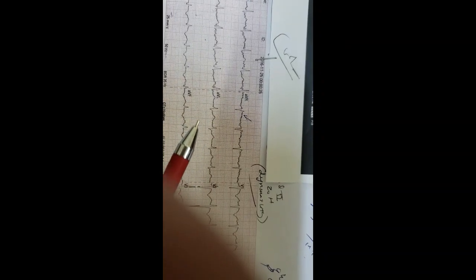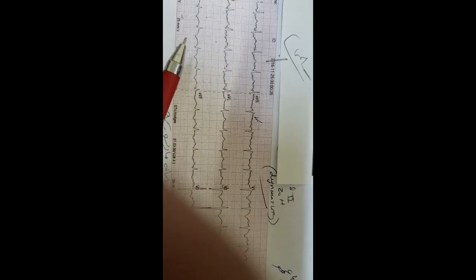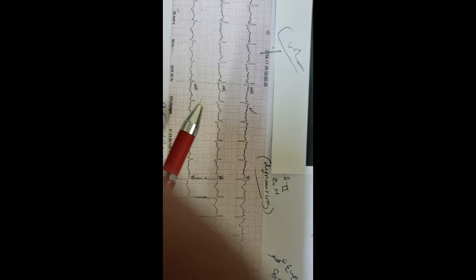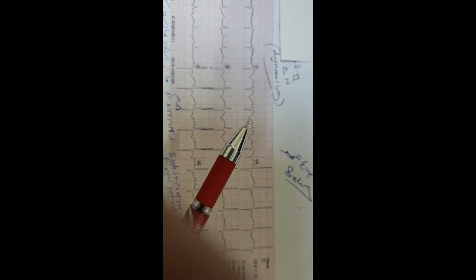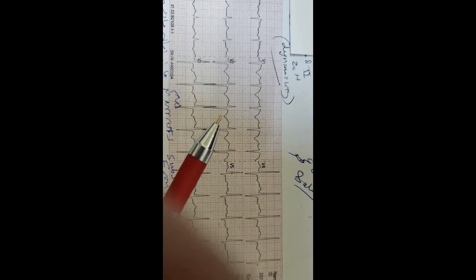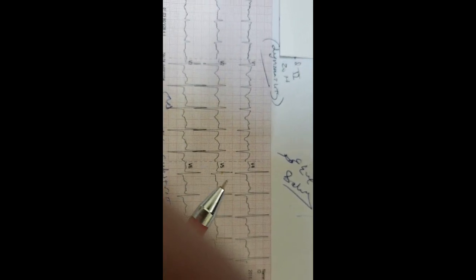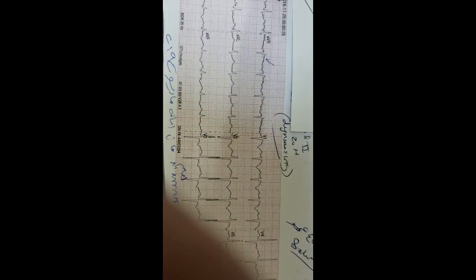This ECG shows sinus tachycardia, T-wave inversion and a small Q wave in lead 3, an inferior lead, with elevated ST segment and mild elevation in V1, and T-wave inversion similar to that of lead 3, and T-wave inversion in V1, V2, V3, V4, V5. She has chest pain.